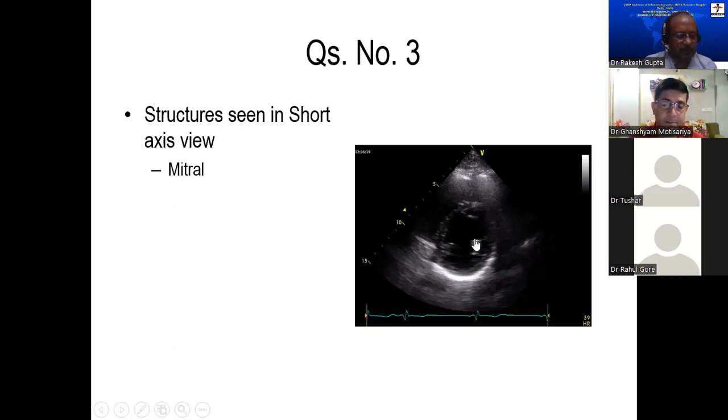Yes. Right? Okay, suppose you don't see one of these two papillary muscles, either this is not seen or this is not seen, following some insult. What is that insult and where are the papillary muscles? Maybe you are talking about parachute. That is congenital. Good. Suppose you had a patient who had chest pain, and you could not see one papillary muscle. Okay. What does it imply?